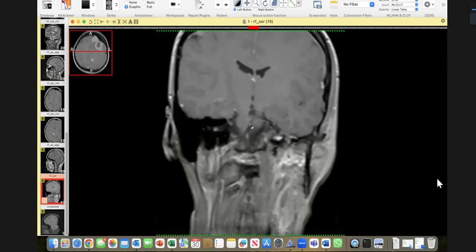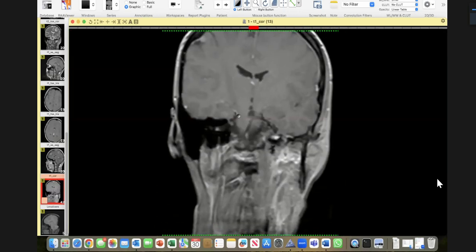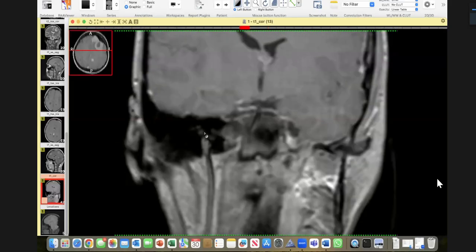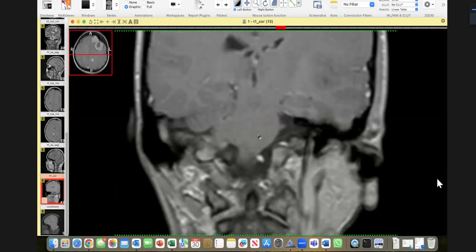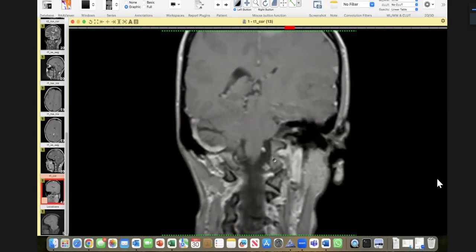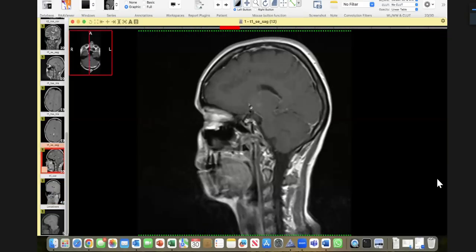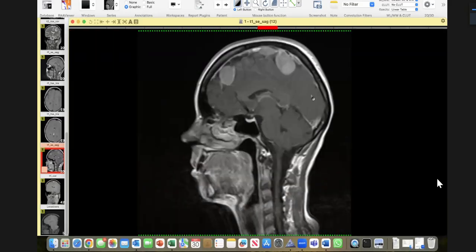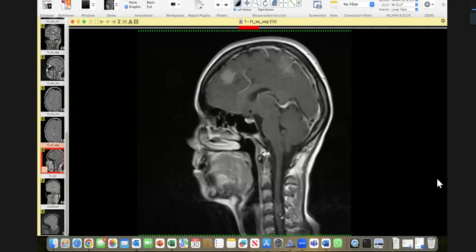Actually, the patient has got bilateral acoustic schwannomas. And here you are. You see, this is enhancing here, and another one is enhancing here, bilateral. But you did not ask for that. So conclusion, I could have shown you this, but the way the Viva went, I did not show you. And here the key thing was that if you see here, there was an ependymoma in the cord also.